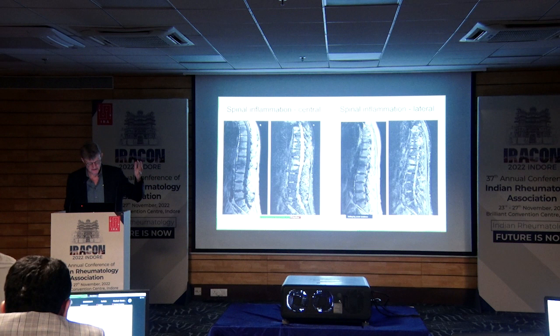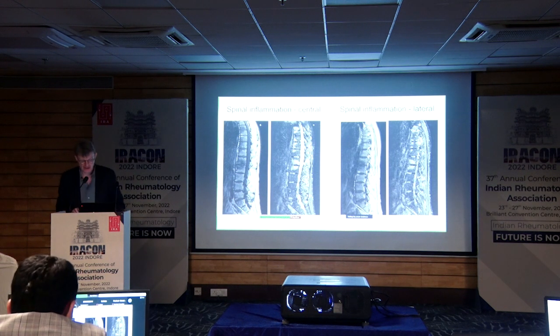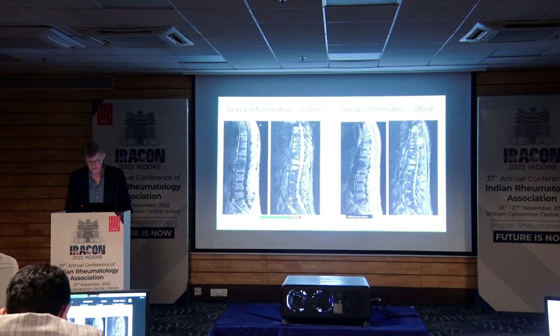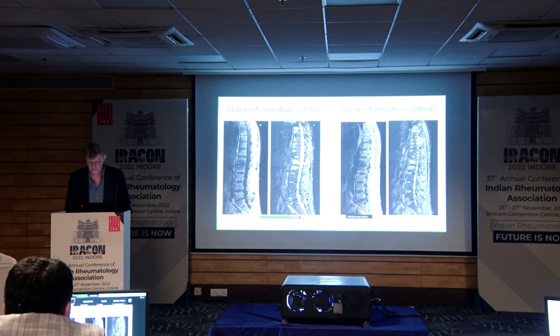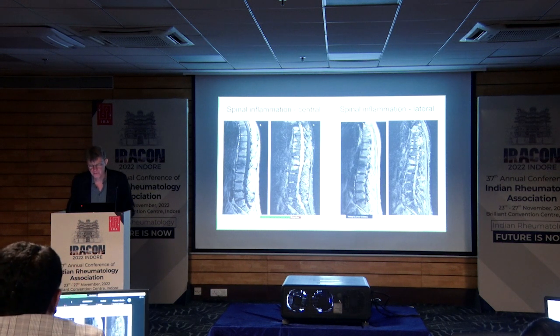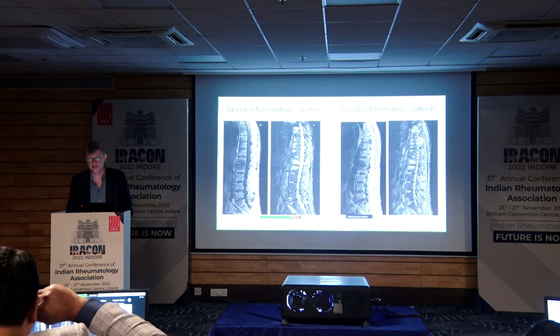I've shown you this image here with the vertebral body changes. Here on the right, two images here, that's more lateral. You can see you cannot see the spinal canal anymore, so you're lateral to that. And you see the area which I said before, the pedicle and the facet joint. And here, this joint here is very bright. You can also see it is even dark on T1. So here you have a facet joint inflammation. So the most important thing is to find out where you are anatomically. That's a difficult thing. Thereafter it's quite easy, it's just bright.